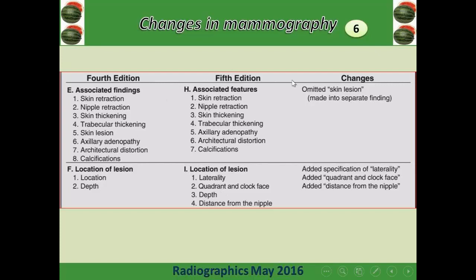This is also among the other associated features: the location of the lesion. Regarding the location, they added specification of laterality, quadrant, and clock face with distance from the nipple. I always use it; you must report the distance from the nipple, especially in small detected lesions.